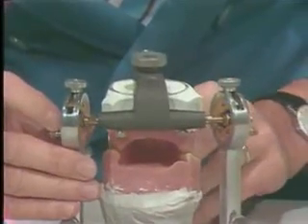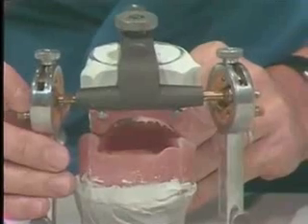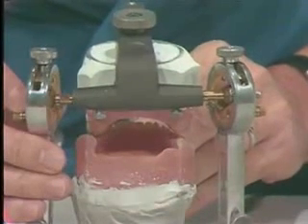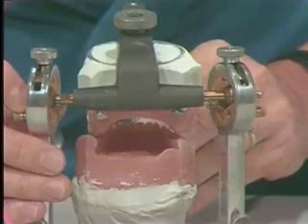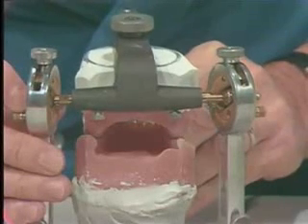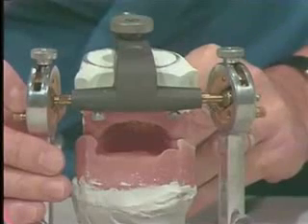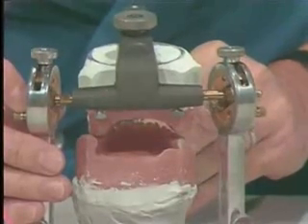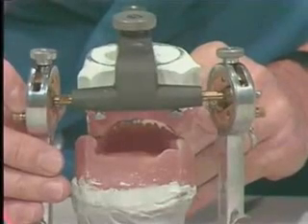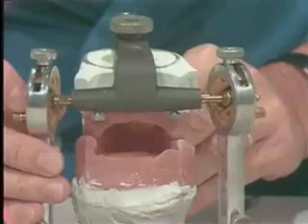Now, if we go into left working in this area, the upper member then moves to your right. But now you try this yourself and move your mandible and go into left working, and you find that your mandible moves left. You should do this. Try this on yourself now. You move into your left working position, and you find that your mandible goes to the left. So you can see there's a reverse direction when you go to the articulator.